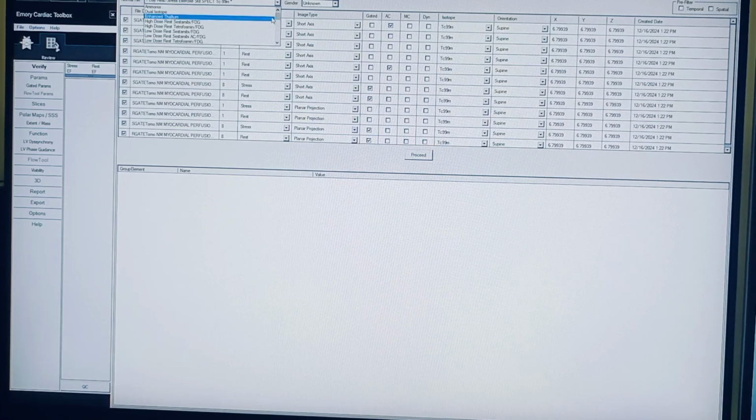What you have selected is rest and stress, but here you have selected one day, and for one day there are different ways of doing the scan, like with attenuation correction, without attenuation correction, with low dose, high dose, with treadmill exercise, pharmacologic stress. So you have to select the database which exactly matches your study. For example, this study is standard dose, rest and stress with attenuation correction.